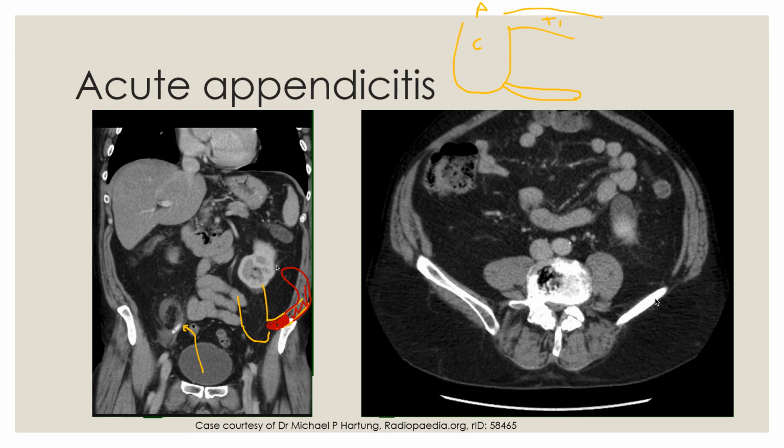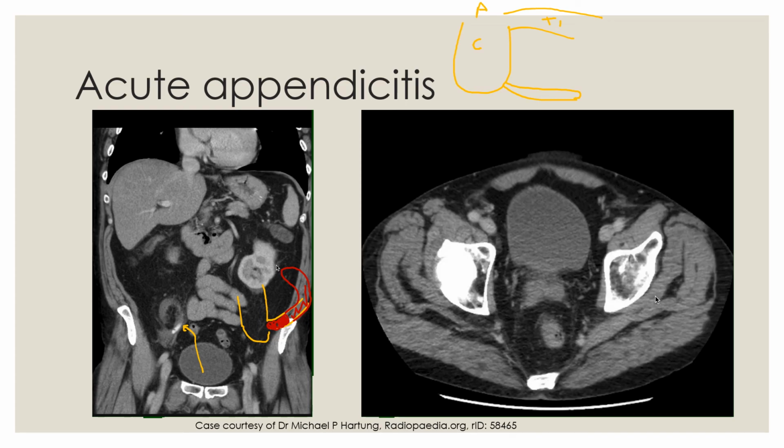And so we can also see this on our axial images. So let me just show you there. So this is the appendicolith, and the appendix, if you just keep looking, will be coming out here. So I'm just going to slowly, it's coming out there. There's the appendix. Here's the appendix, and it's dilated, fluid-filled, and there's lots of mucky fat around it, which is seen by all of these strandy areas. And this is acute appendicitis.